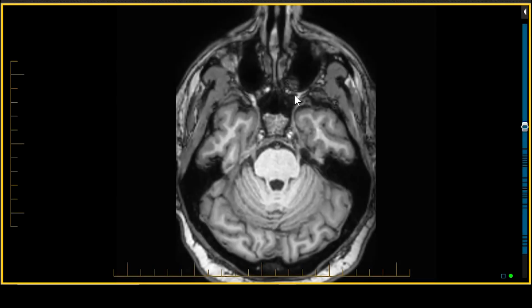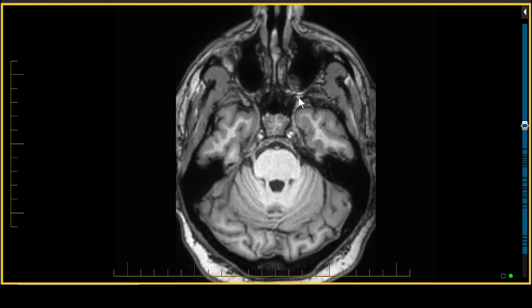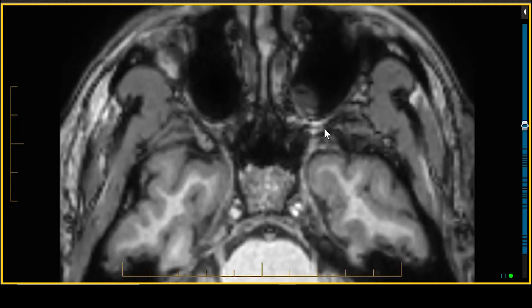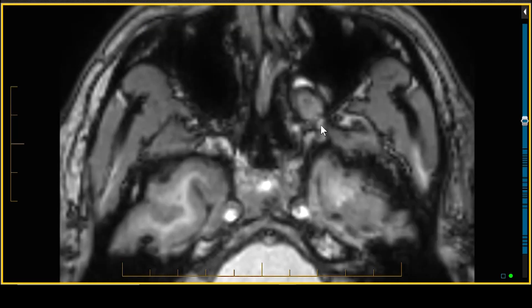So this is the location behind more or less the upper border of the maxillary sinus. These 2 layers of fat represent bone marrow. This is the little fossa right here. The ganglion is located in this region. We can blow it up a little bit so you can see. It's a horizontal coursing space that then will exit antero-suprolateral into the inferior orbital fissure, and there are other important connections that we'll dive into more deeply in other vignettes.